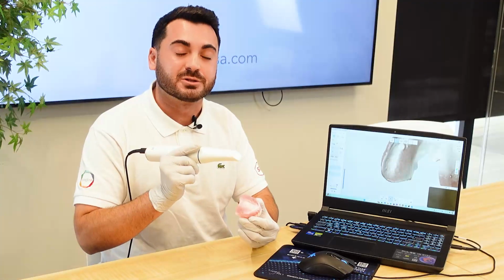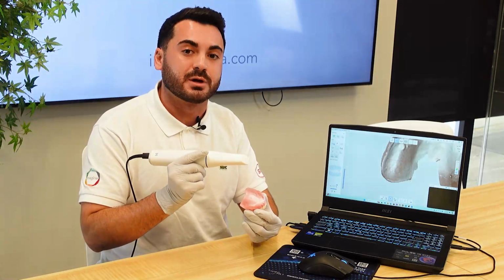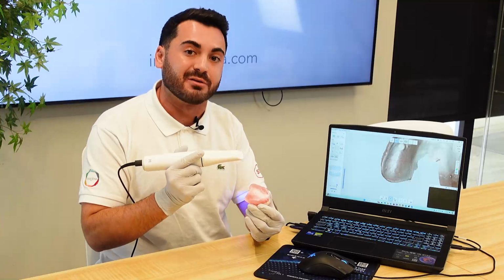Once we have our fitting surface scanned, we're next going to move on to our border. For this, we want to make sure that we're constantly moving back to our common data, which in this case is going to be our fitting surface.